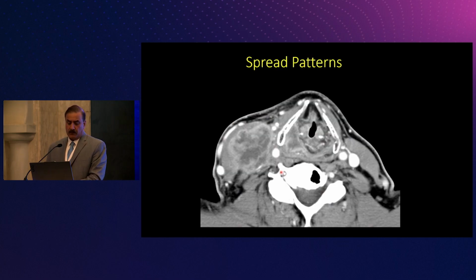This looks like it is getting into the piriform sinus mass, but it has blown through the ligament there. It is involving the carotid space. And when you have involvement of the carotid space, you directly go to a 4B. So that is a non-operable state at this level, and this is a big, huge lymph node on the ipsilateral side. But what is more important is to realize that there is involvement of the carotid space here. Circumferentially, the tumor is around the carotid.